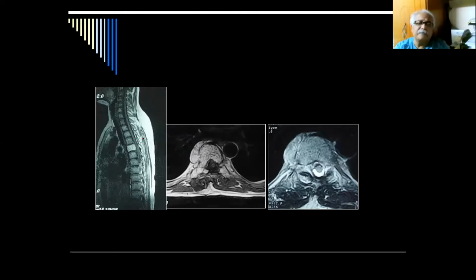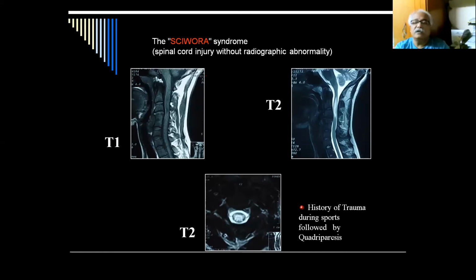Okay. Sometimes a hemangioma will look like this white shadow. Sometimes this is an incidental finding. You don't have to be very cautious. Okay. So this is probably sometimes a term the radiology people will follow: spinal cord injury without radiographic abnormality.